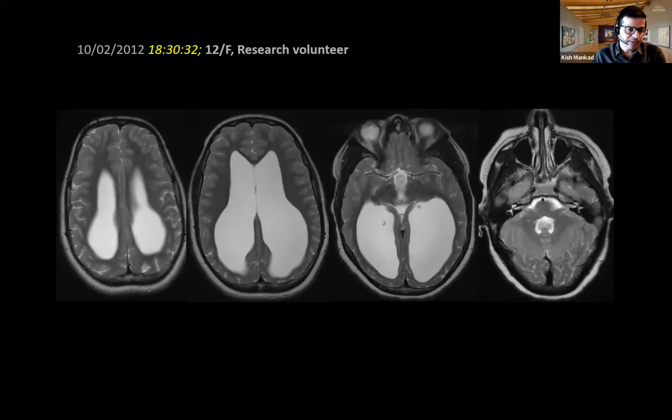And of course, the options here are, should we recall, rescan? We looked at the sagittal, the ventricles were big, but there was no real features of raised pressure. You can see that there is no interstitial edema around these ventricles, and even though they are ballooned, they're not under pressure. And the important thing is, once you take a balloon and you fill it with water and you enlarge it, or you blow the balloon with air and it deflates, it will never go back to its original pristine state. They lose their compliance.